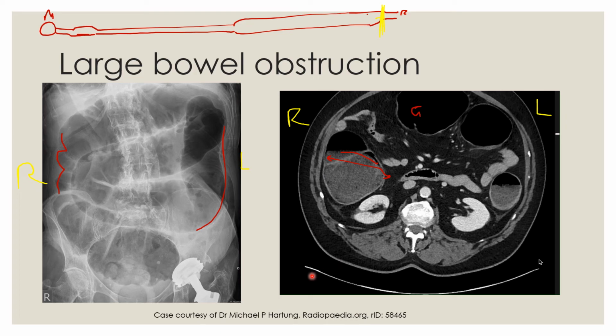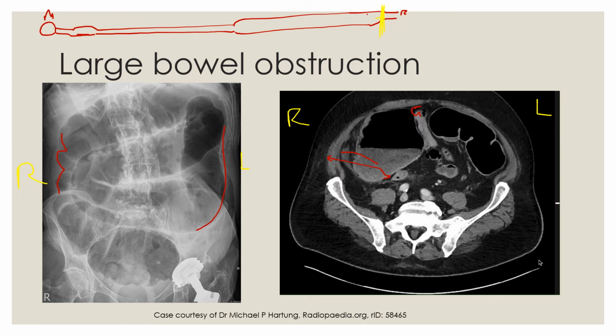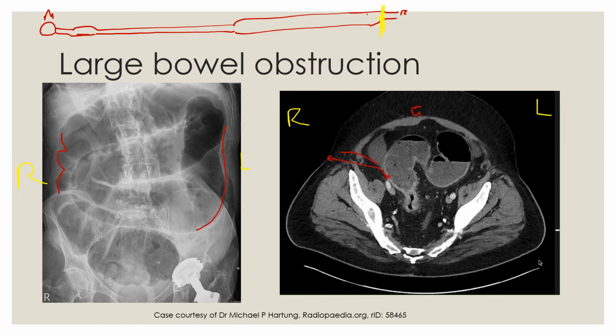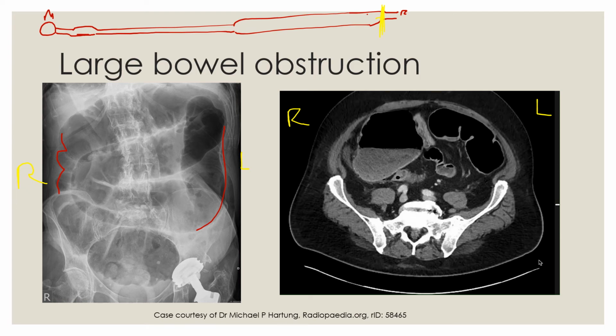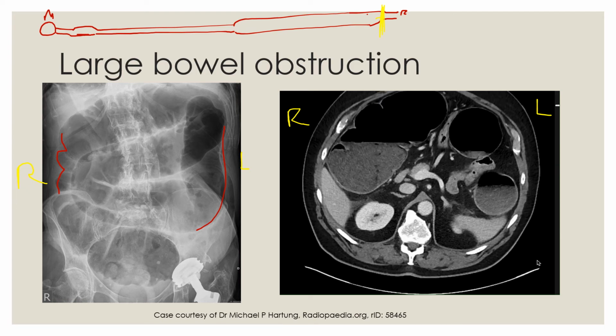And as we scroll down, I'm going to start from the ascending colon here. I'm going up now. So we're going up the patient, ascending colon.